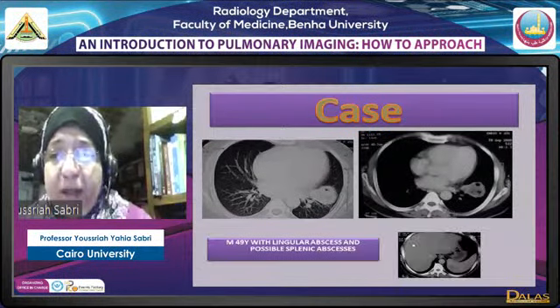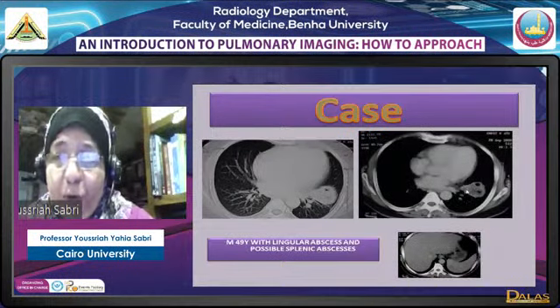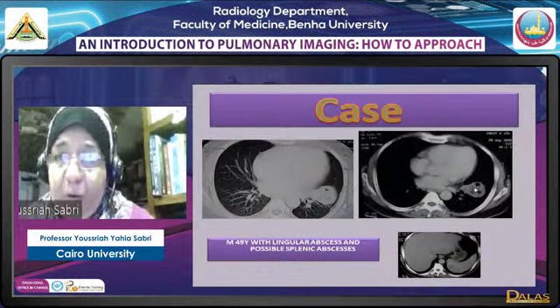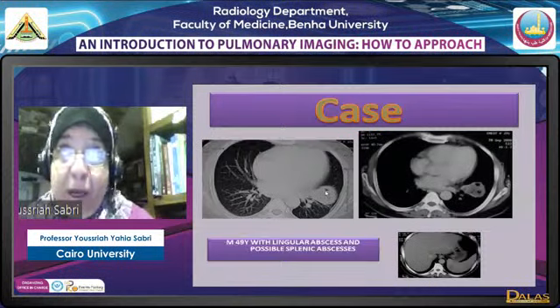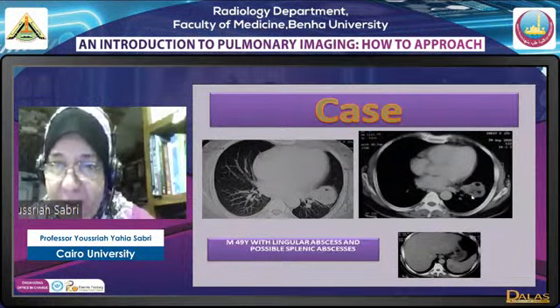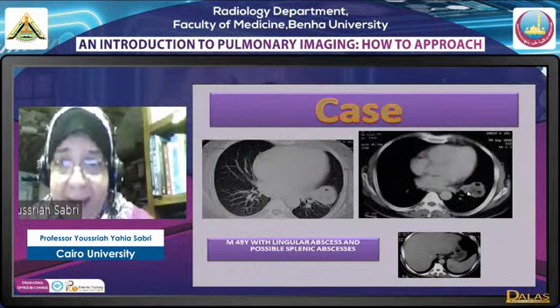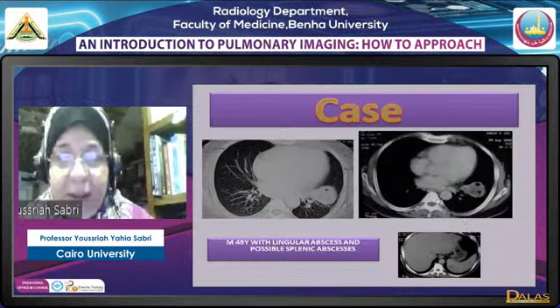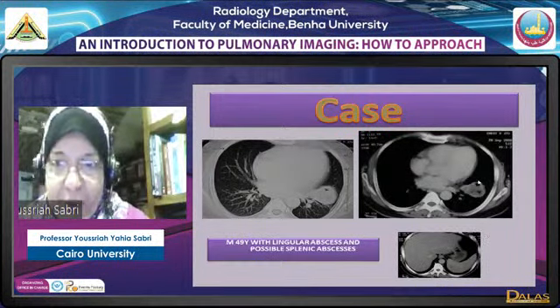When we do the mediastinal window, we find that it had fluid and air locules. So the lumen actually is central, not eccentric. The only thing that was apparent in this window was the locule, so it gave me an appearance of a misunderstanding that we are dealing with eccentric. However, it is totally central with a totally uniform wall. This is an abscess. So strengthen again, it's very important to see the mediastinal window for tissue characterization.